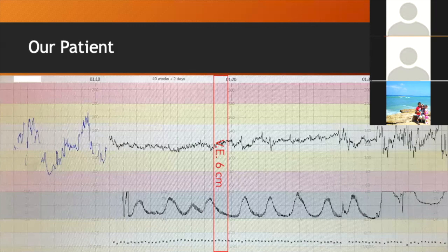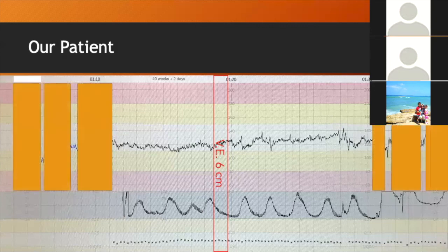Okay. Baseline. So to assess the baseline, I'm rushing through because we're already at 9 o'clock. So just a very brief description. We're not going to finish the case. As I said, there's not many important features. Okay, so you're basically going to block out accelerations, decelerations, and episodes of increased variability. What normally helps is look at what you actually have. So I'm assessing 30 minutes here, and I have a good 18, 19 minutes. That's more than 50%. That's okay.